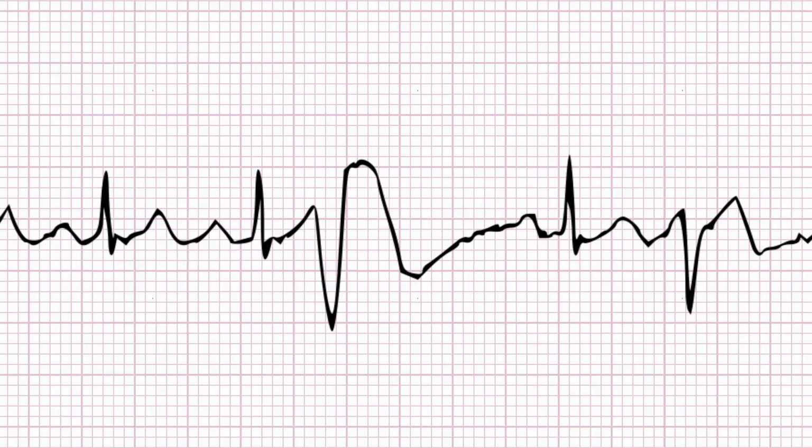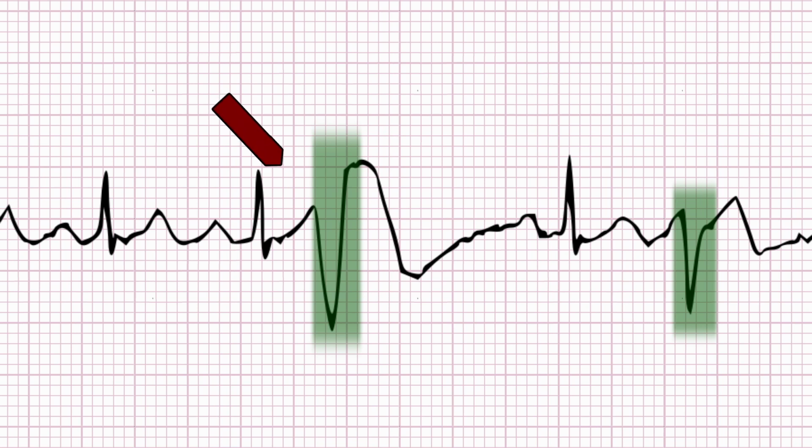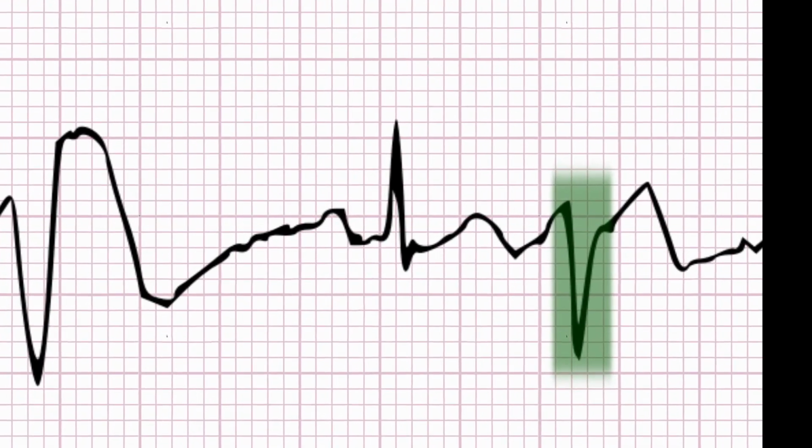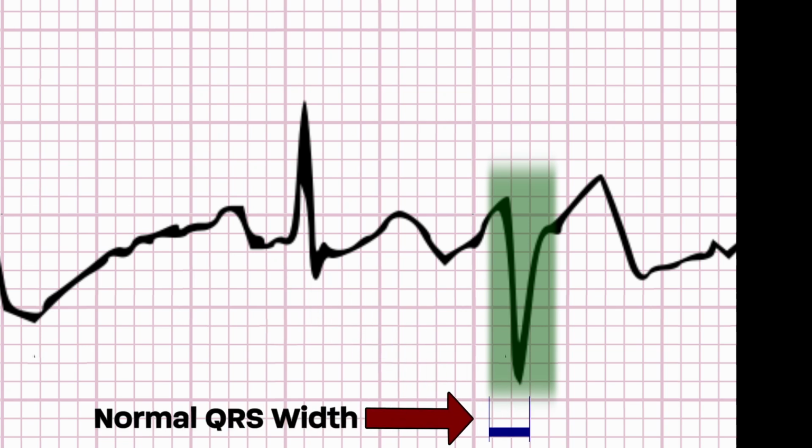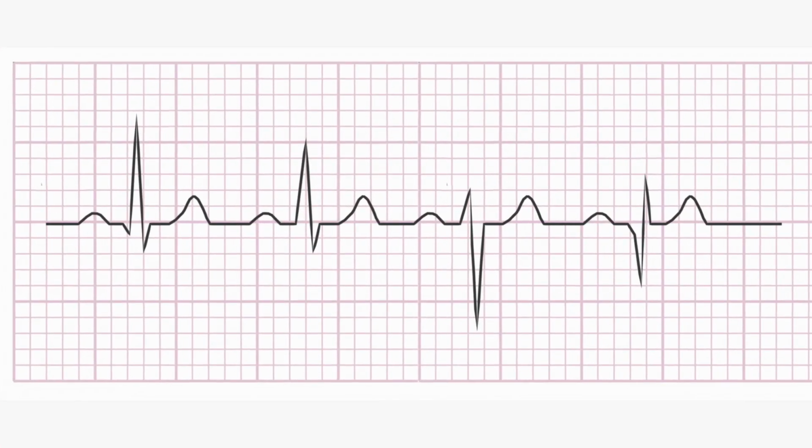One way we can apply this knowledge right away is by using QRS width to identify ectopic complexes. Ectopy is a beat that originates from a non-normal source. It's coming from somewhere other than the normal pacing focus in the heart. We'll hit this stuff in more detail when we start talking about natural pacemaking, but for the moment, this is what's called a PVC, or a premature ventricular complex, and we can tell that because it's significantly wider than its accompanying complexes, and it's occurring out of sequence. It's happening too soon. That's what makes it premature.